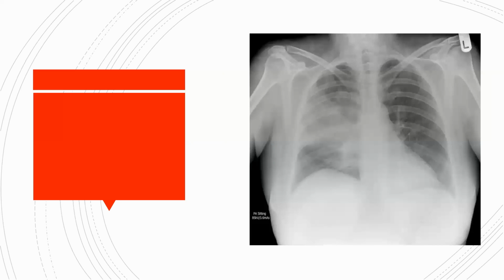Right, what is this one? What's going on over here? Okay, someone is asking, is it collapsed?